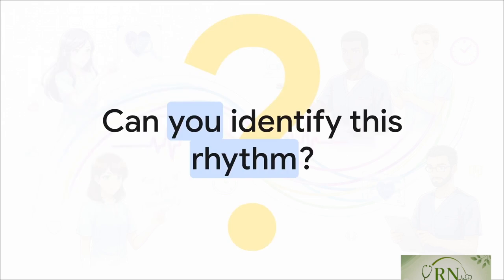All right, let's jump right in. I want you to step fully into the role of a clinician with me for a second. Imagine you're at the nurse's station, or maybe you just walked into your patient's room, and someone hands you a fresh EKG tracing. The million-dollar question we have to answer is, can you identify this rhythm? We're not going to just guess, and we're definitely not jumping to conclusions based on a gut feeling. We're going to let the hard data tell us the whole story.